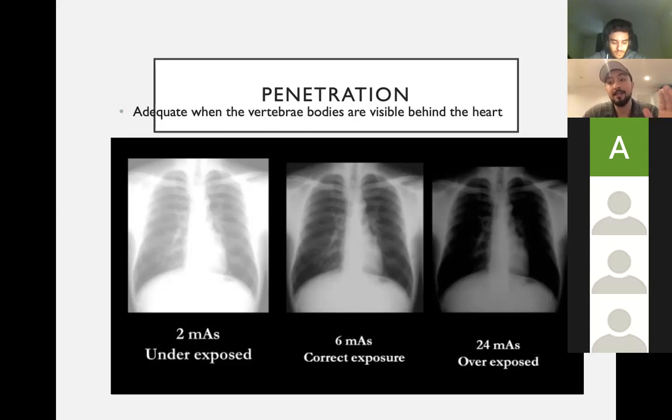It has exactly the right amount of radiation going through the lungs. In this one, you can differentiate the soft tissue, the low density tissue, from the high density tissue, which appears bright white. The high density tissue absorbs more radiation, and because it absorbs more radiation, it appears brighter in the X-ray.